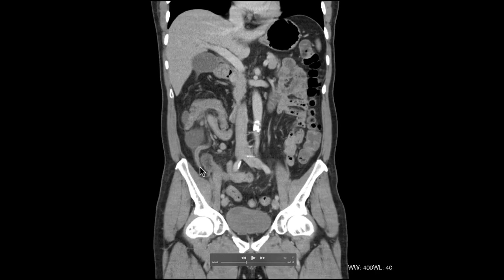And you can see the appendix poking out around the side there. That's the appendix being sucked into the... You can see that, that's the terminal ileum, is it? Yeah, that's right. You see it going in there. That's really quite something.